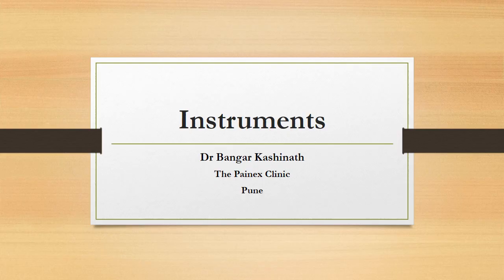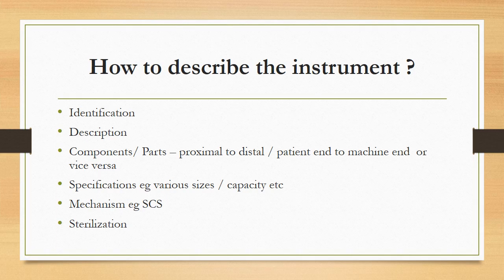Today we'll talk about the instruments used in pain management. How to describe the instrument?